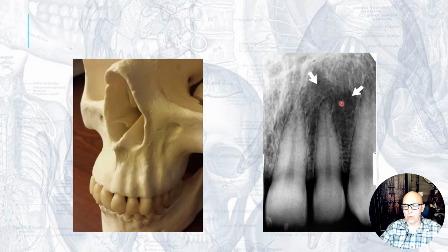Okay, here we're pointing out this radiolucency that kind of surrounds the apical portion of the lateral incisor. Sometimes this can simulate a periapical lesion, even though it's not, it's just an anatomical structure. And so here I outline it for you on the skull. And just like most things, in some patients it's more pronounced than others. And you may see a little fossa here. In fact, most times it extends more over the lateral incisor apex.